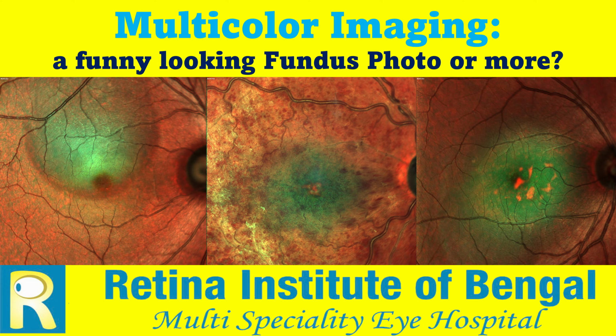So this week we'll be discussing multicolor imaging, and the question I'm trying to answer is: is it just a funny looking fundus photo or more?